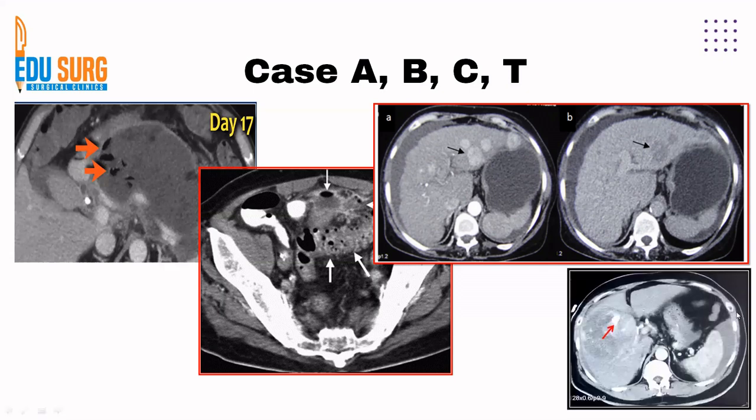Another case of a liver lesion. You can see the aorta is wide, there is free fluid. If you can see, the free fluid will be different in images. This is because this patient had an arterial blush. You can see the arterial phase. This is an arterial collection in the tumor, basically known as arterial blush. This was a bleeding hepatocellular carcinoma. So these are some of the examples.